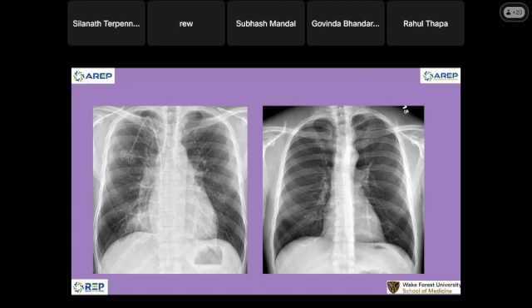Okay, so you said big heart, right? Does the heart look big to you here? Something different. The density of air is different. Is this a normal heart size? This is your heart border, normal. And you're just seeing something weird here, fat. See that? It's almost like the whole thing is fat.